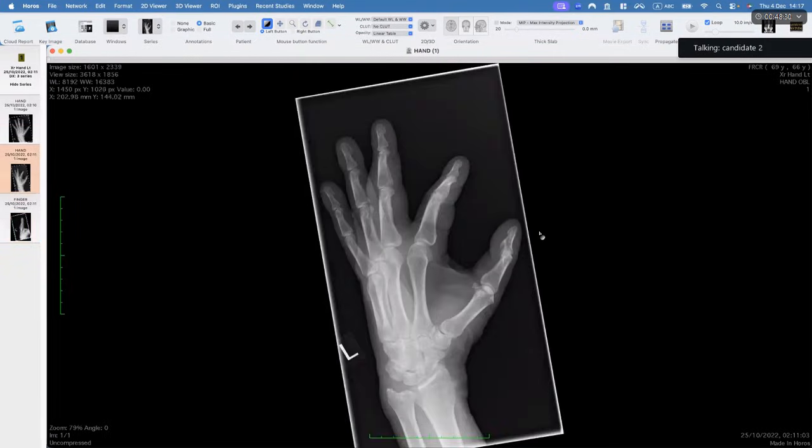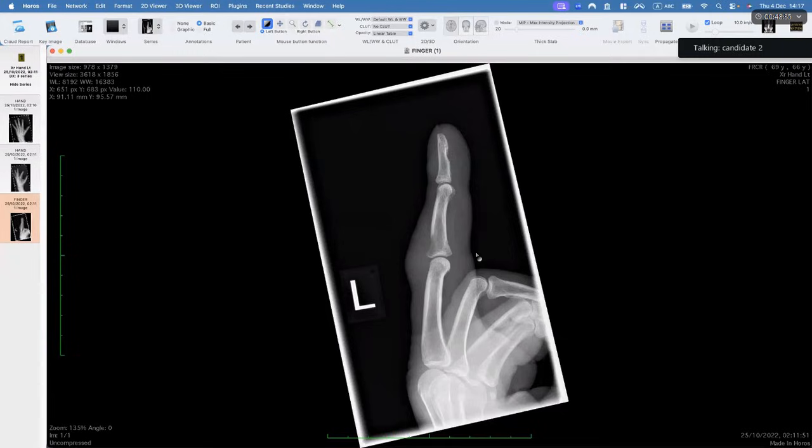The second question was whether it is an intra-osseous pathology or an extra-osseous pathology. I am thinking in terms of extra-osseous or soft tissue pathology, because if it was an intra-osseous pathology, I would be seeing an expansion of the medulla, some kind of cortical changes, and if it is extending to the soft tissues, there should be some giveaway of the cortex. So I'm not seeing any changes within the bone to show that it is an intraosseous pathology extending outside into the soft tissues.